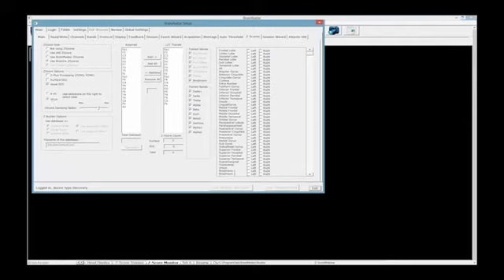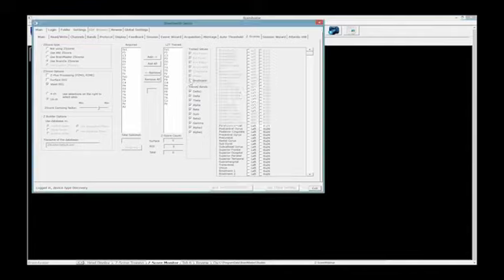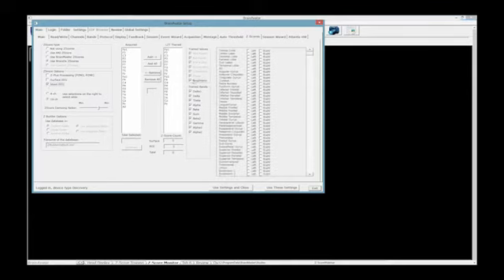Now you're also going to notice that right here, all of these are grayed out, and the only thing that's applicable right here is, oh sorry, you're right, Dr. Gennardi, it's 6,239 to be exact. But what you're going to notice right here is that Brodmann is checked. And now if I uncheck it, that all disappears. And if I uncheck this, that complete thing disappears right there. So once again, if I check Voxel EEG, and I check Brodmann, now I can select regions of interest and utilize those for my sLORETA ZScore training.